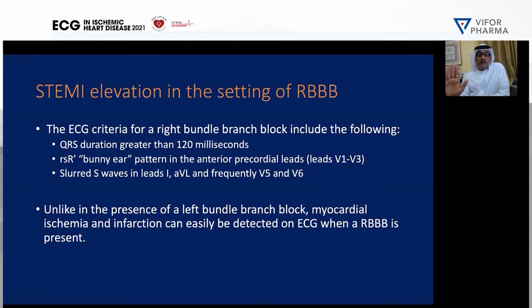So when you have a left bundle, you can't assess the ST segments, as I said, but you treat all left bundle as a STEMI. In right bundle, no. If you don't have ST elevation, then it's just a right bundle. If you have ST elevation, then there's a right bundle and there's ST elevation there. I hope it's clear. I kind of mixed it up, I felt, but I hope I am clear. In the setting of right bundle, you can diagnose STEMI. In the setting of left bundle, you treat left bundle as a STEMI.